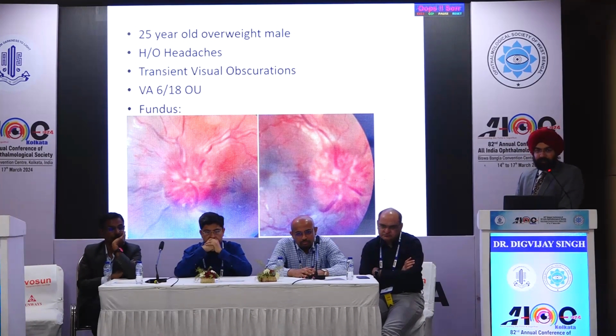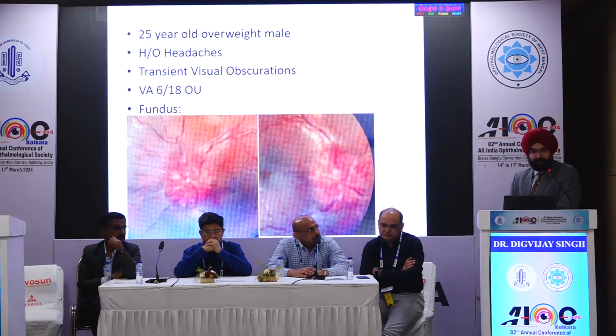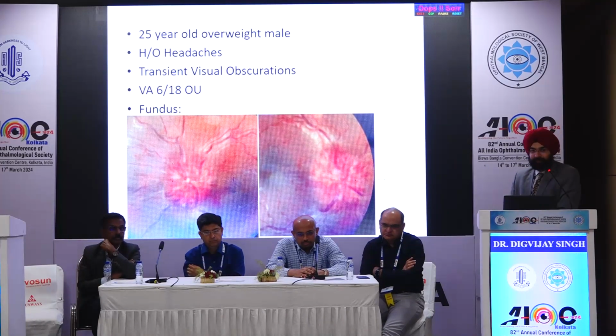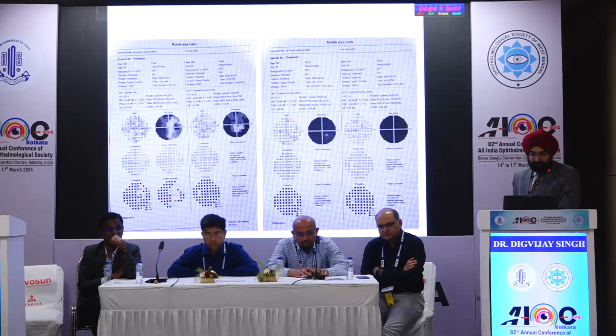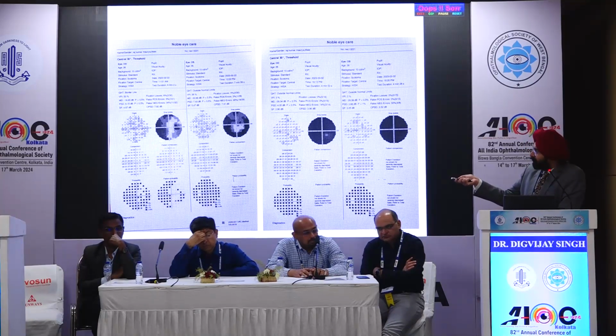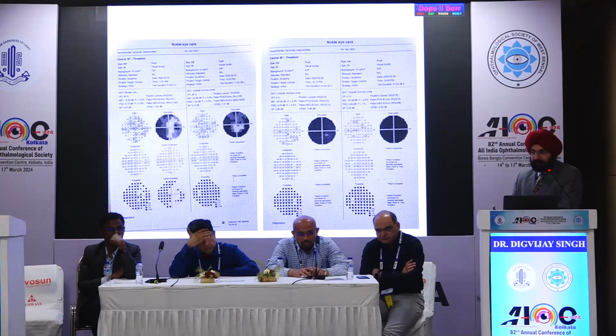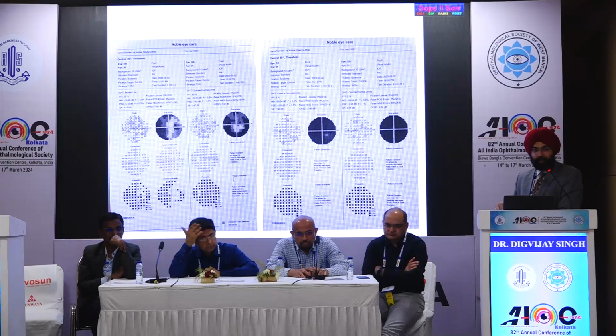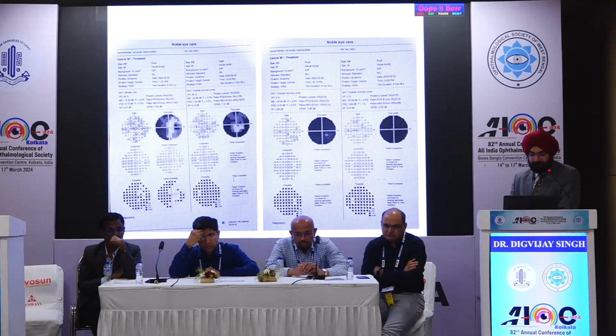He was also on some other medications for another hormonal issue that he was having, alongside a lot of the other things that he was taking. You can see that the vision was less. Between the first visit that he made to me, I'm showing you two fields that are just about a week apart. With this fulminant kind of papilledema, look at how quickly the field has constricted within a period of one week, despite starting him on some kind of therapy.